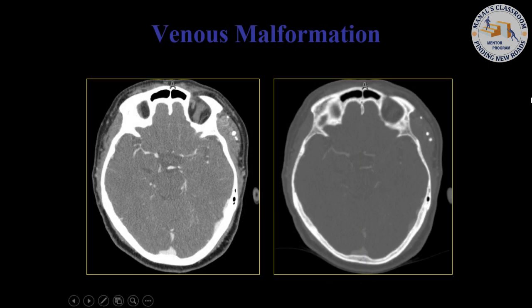And this is the other characteristic of a venous malformation. So we have a venous malformation that's involving the muscle, but what's the other characteristic finding that this venous malformation has? It contains what? Phleboliths, right? Perfect. So the two criteria that we look for in venous malformation is number one, it's located in what structure? Muscle, and it contains phleboliths.